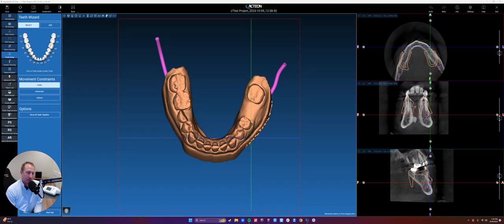Okay, so in this patient example, we've done our initial read, we've brought in our data, our intraoral scans, we've done our CPR settings and drawn our nerves. And now in the teeth setup phase, if you decide you'd like to do a wax up, this is where you stop, okay? It automatically has our anatomy pulled up because that's what we named as anatomy, was the mandible.